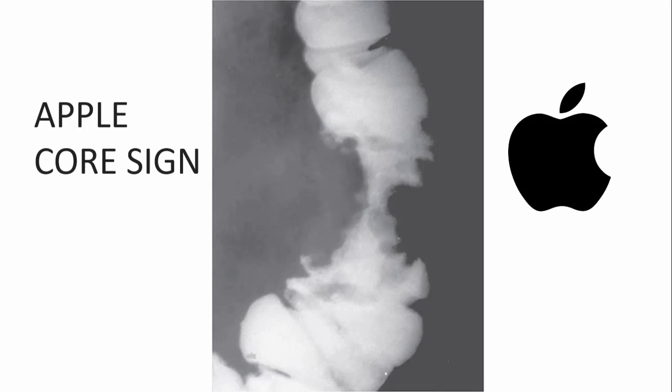Well, the time is up. Let's get into business now. I am sure you all have eaten an apple and noticed a half-bitten apple as shown in the picture. Well, this is the typical apple core sign seen as a half-bitten apple. This typical sign is highly suggestive of colon cancer. You might not want to miss this typical finding.